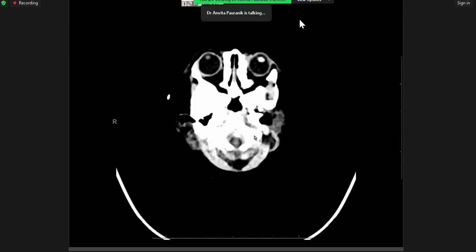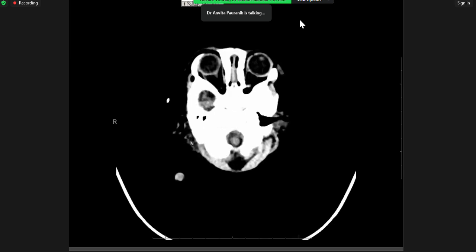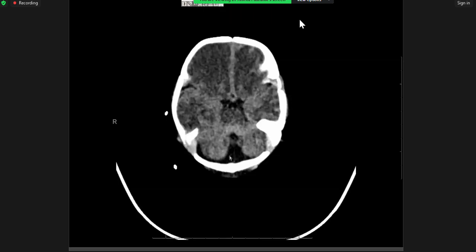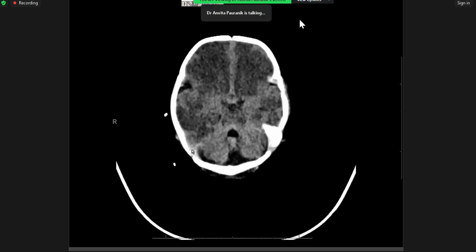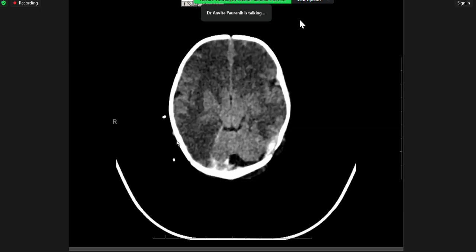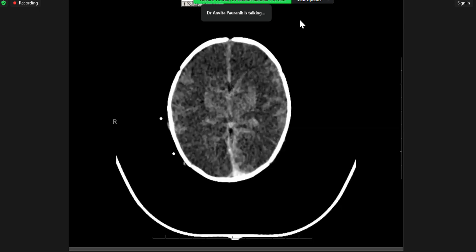All right. So this is a 4 day old, an even younger child. Is it again you, Rishabh, or Julie? You want to just practice speaking? Yes, ma'am, I'll answer. Okay, so let's look at this together. So they are only 4 days old, and lethargic, and there is clinical history, obviously, but I'll explain later. This is more obvious than the first one. So how do you describe this?